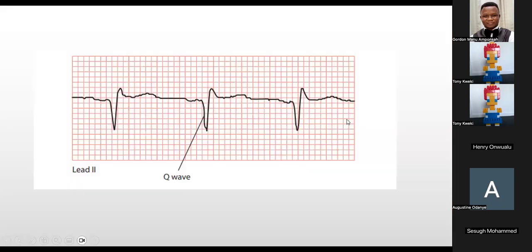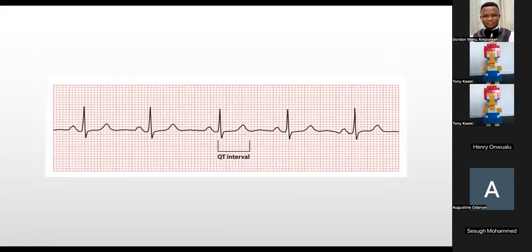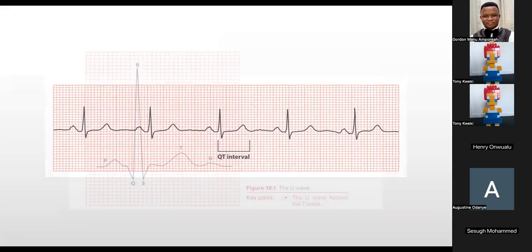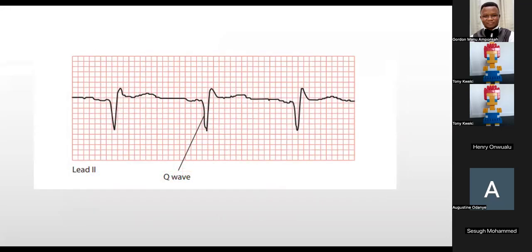So as much as possible, I'm just going to make this discussion interactive. So we know all this. I don't intend to go through all this. These are basic forms of ECG that we are quite used to. And we know all these. We know a good Q wave.